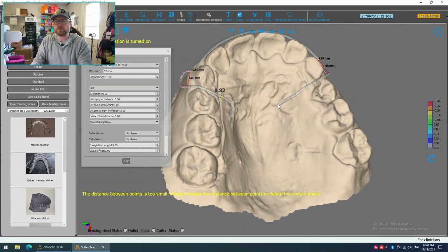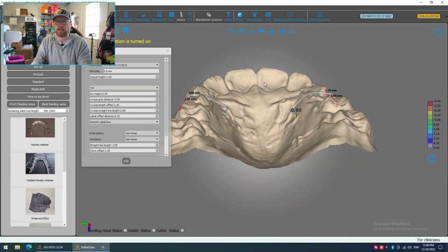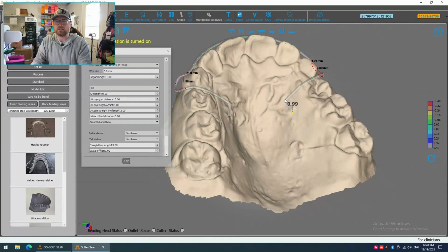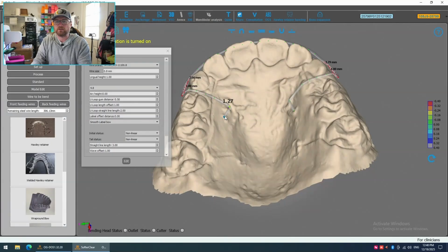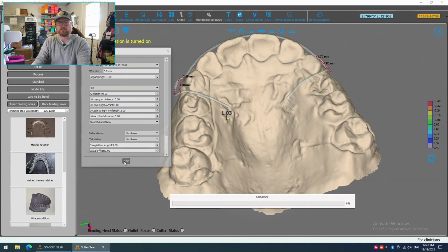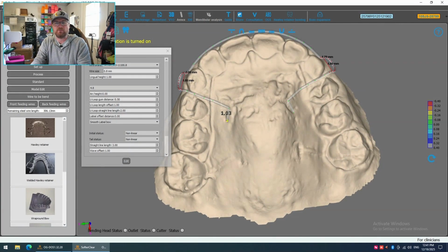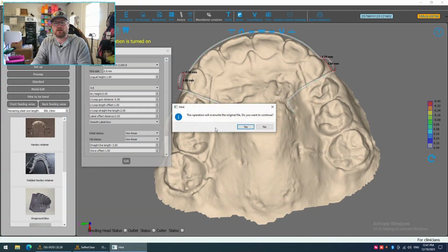And I'm curious, so this may not work. Sometimes I can get away with this. The reason they're bent in different directions like that is just so that as it's coming out of the wire bending machine, it won't collide with each other. But sometimes the mouth is wide enough. Click edit to make sure there's no collisions. If there is, I'll straighten up that one. Yeah, no collisions.